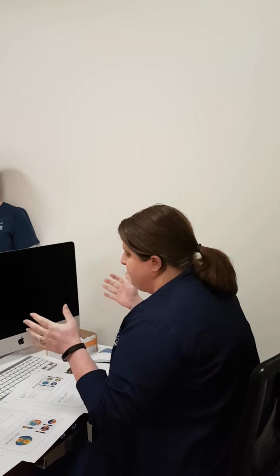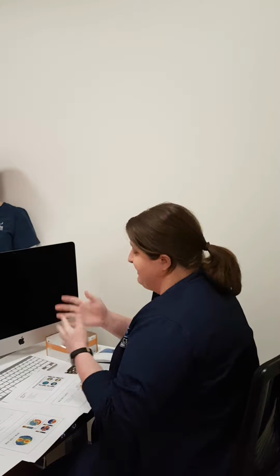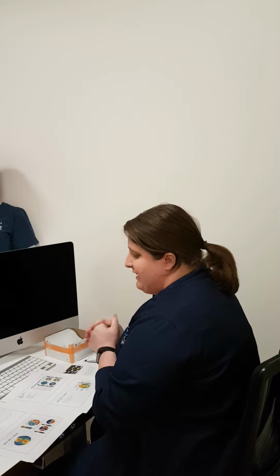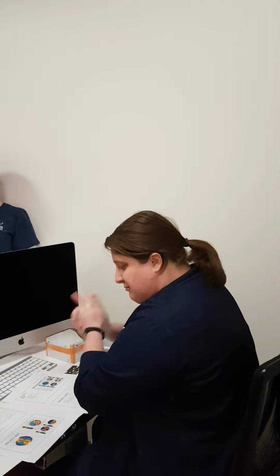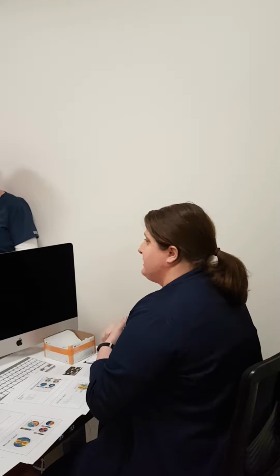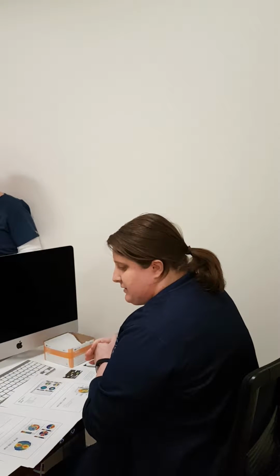It helps to aid progression. Again, we can watch and see if the pterygium's moving, progressing, and so that's a reason we do it for pterygium, scars, Salzmann's nodules. We're just looking for, is it affecting the vision, causing some irregular astigmatism. And then Fuchs, we talked about that, thickness changes we can monitor.